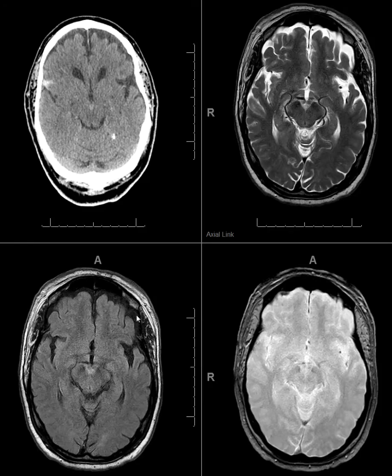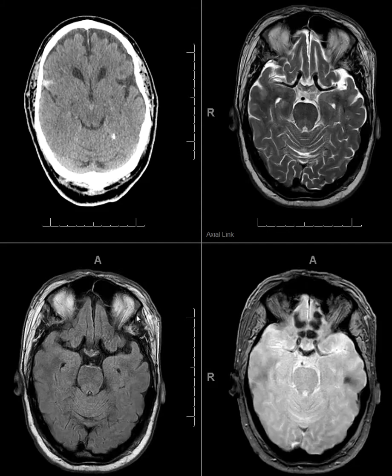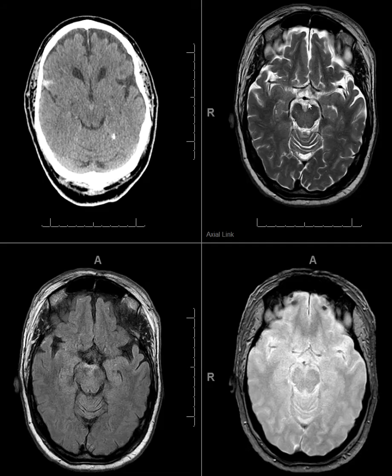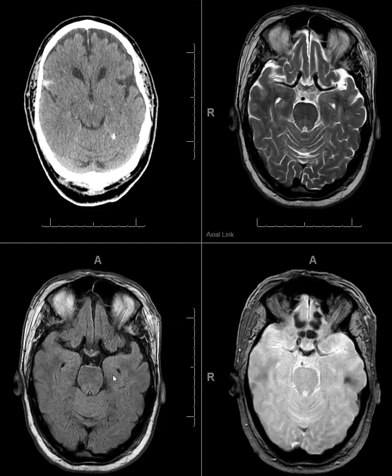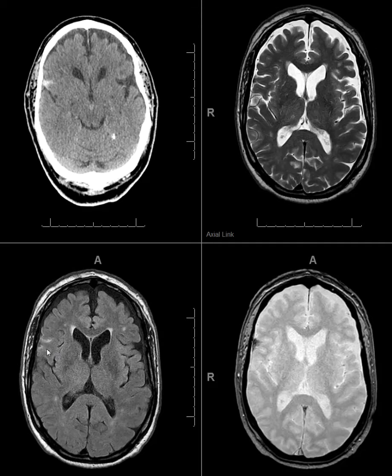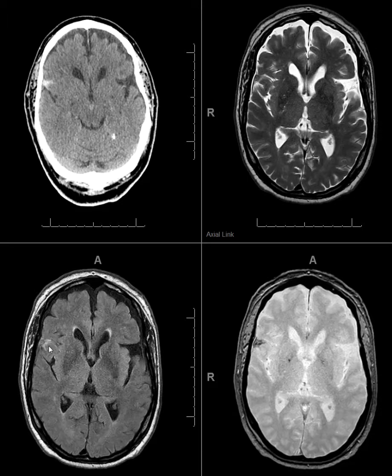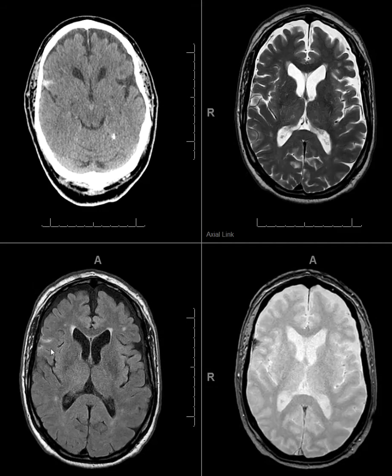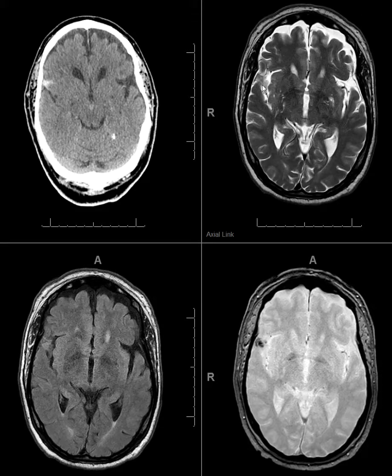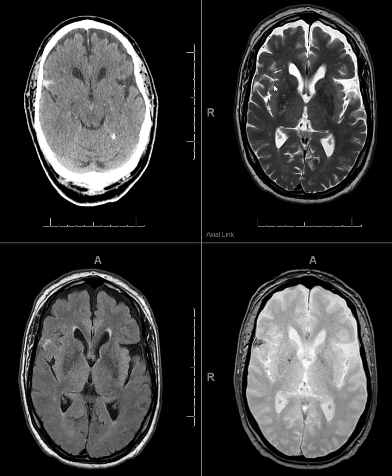First of all, point number one is it's difficult for T2 to detect a small amount of blood in the prepontine region. FLAIR sees it better because of water suppression. You can see it. The sylvian fissure hemorrhage is, I guess, better seen on CT than MR, which were obtained pretty close together, within a few hours. On T2, you just don't see that blood product well.